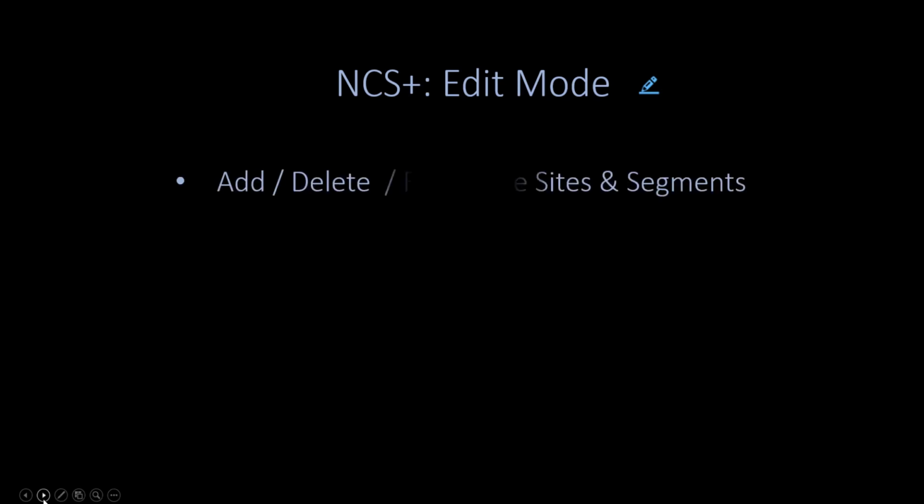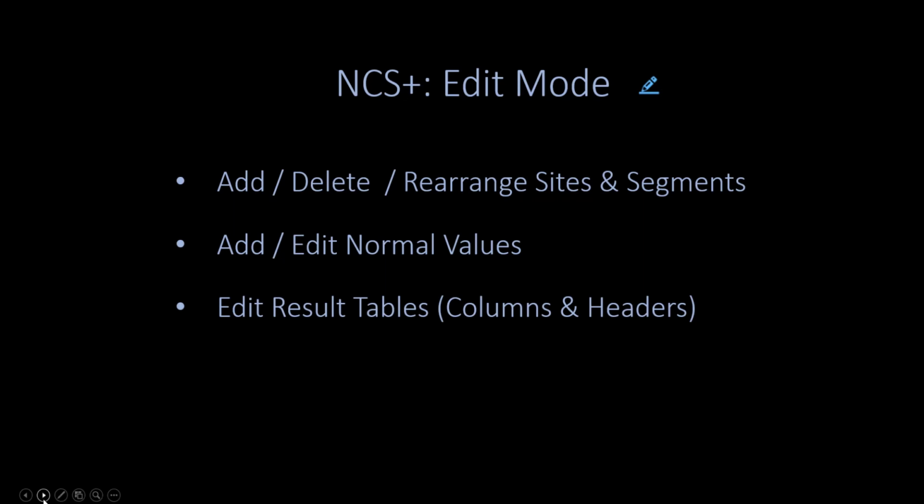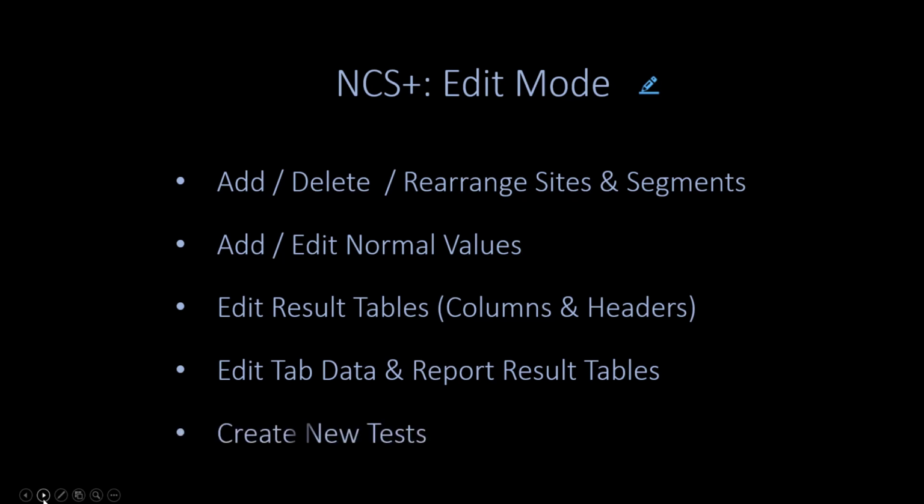Edit mode is a new feature in NCS Plus that allows users to make many customizations directly from the exam screen. With edit mode, users can add, delete, or rearrange sites and segments, add or edit normal values, edit result tables, both columns and headers, and edit tab data and report result tables, and create new tests directly from the exam window.